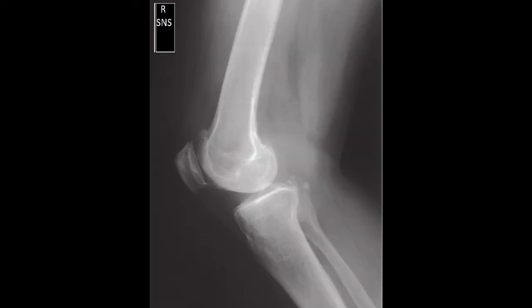All right, then I started on my medial-lateral projection of the knee. Positioning for this one is key, and so is the 5-degree cephalic angulation of the tube, which I had, and that's clear in the image.